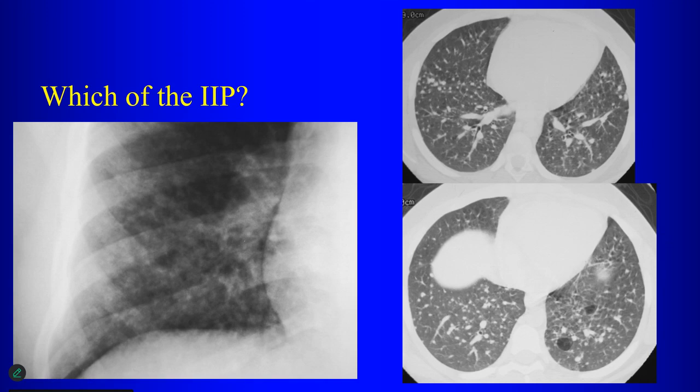Who wants to discuss the findings here? There are many nodules, yes, and there are cysts also. That is correct. So you have nodules and cysts. Now, we've said that the approach to the micronodular pattern on CT is, what's the first thing you want to decide?